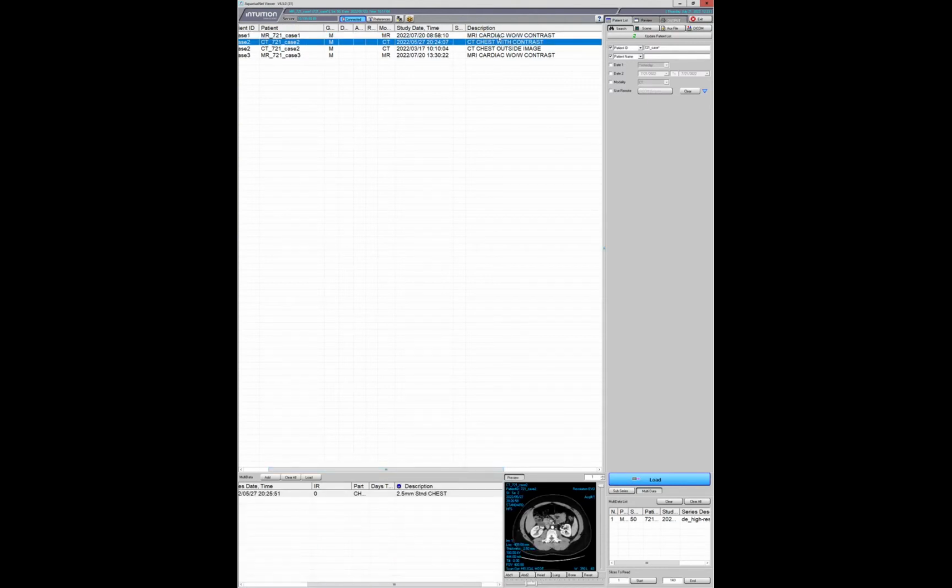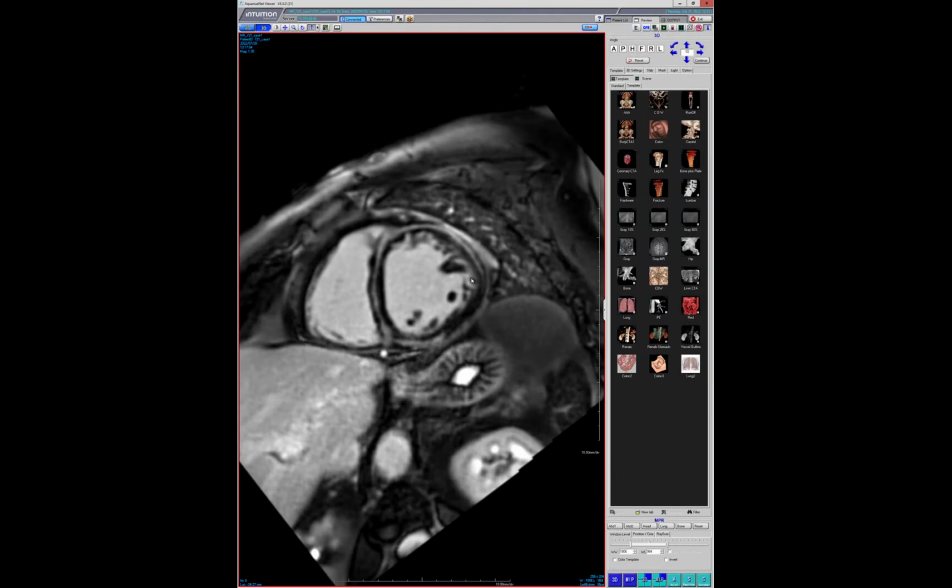So Seth, are these findings reported in that limb-girdle muscular dystrophy? I'm sorry? So are these findings of this kind of dysplasia reported in limb-girdle? Yes, this would be the most pronounced case I saw in the literature compared to what we've seen. I have cases of DMD that have more characteristic patterns like this, but limb-girdle can involve the heart. And just like this, this is really just a non-ischemic pattern.